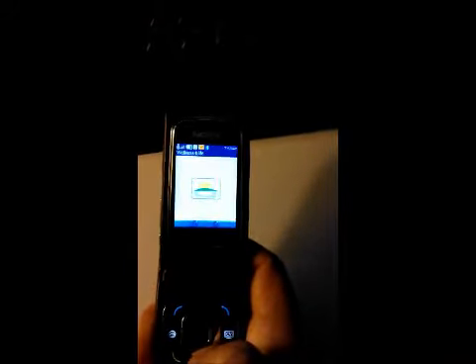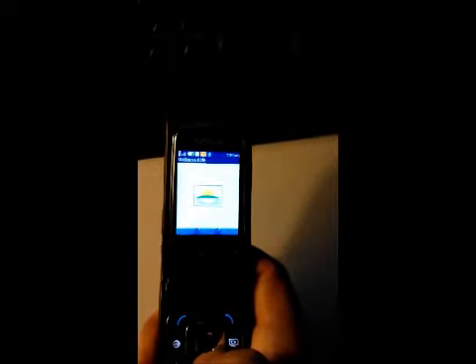Whoops. And then I'm going to go next. It again is now accessing the data on the database. Quite simple. And it is going now to draw a graph right here. You can see from the last 30 days, Sunday to Sunday, what the trends look like, the highest being at 130. And it'll just tell me various info, and you can scoot around to that.